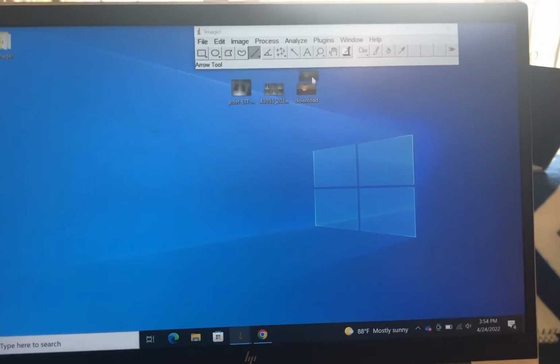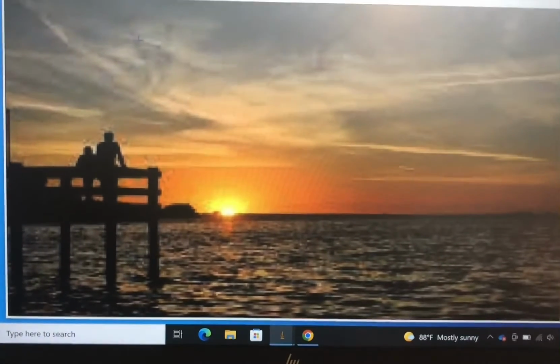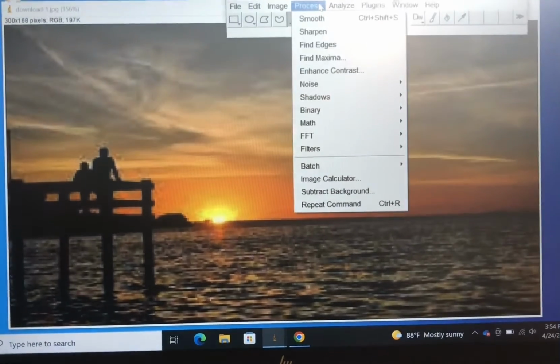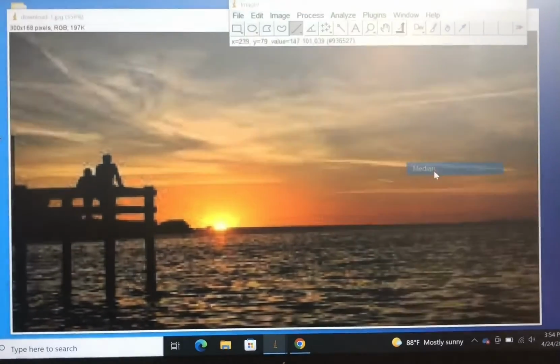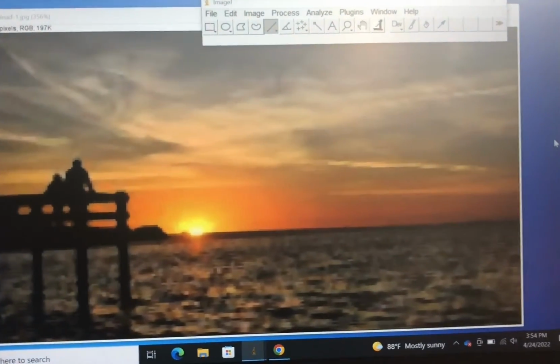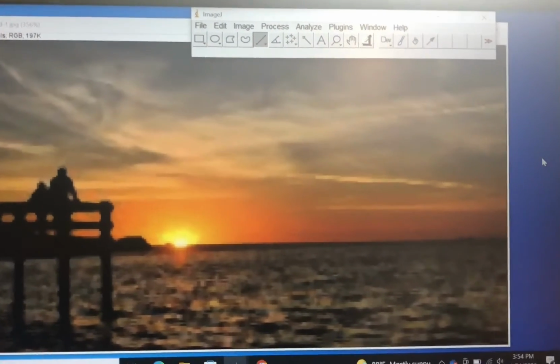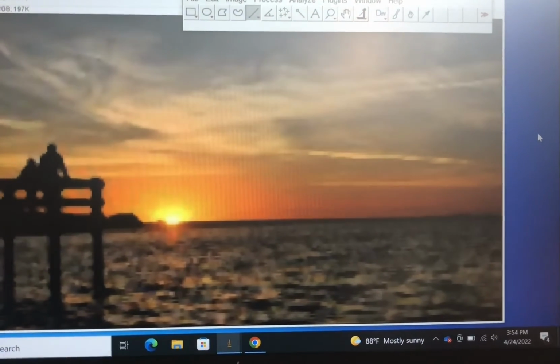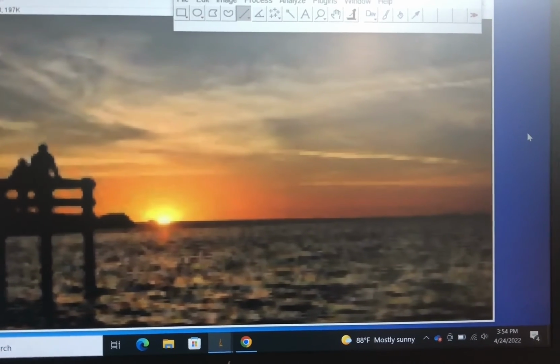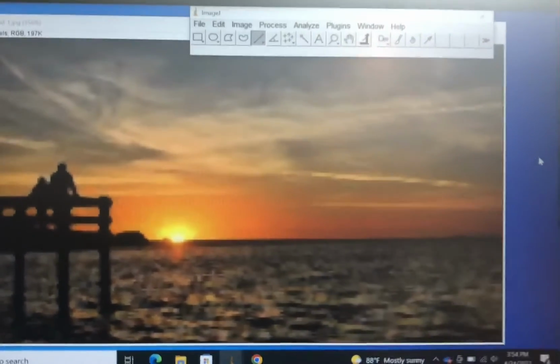I'm going to take another picture, and we're going to blow it up. You see, we still have those pixels. We're going to use the median filter. The median filter is similar to the mean filter, and that one to me looks a little smoother than the mean filter. Basically what it does, instead of using the mean of the nearby pixels, it uses the median to get rid of that fuzziness and to filter the image. Reducing the noise. Both filters reduce the spatial intensity, so you've got a clearer picture.